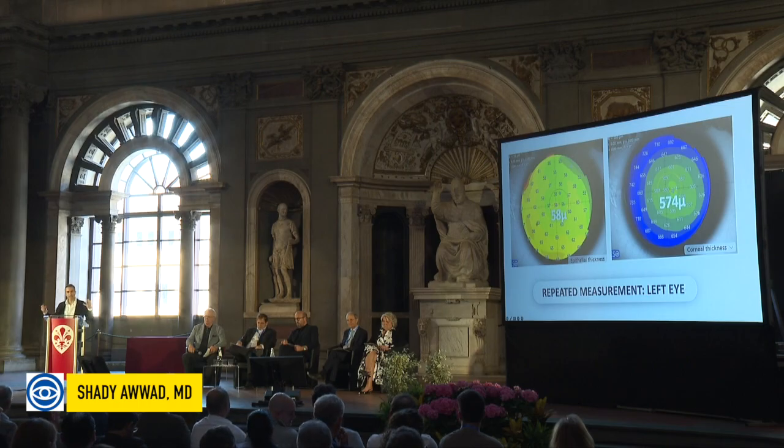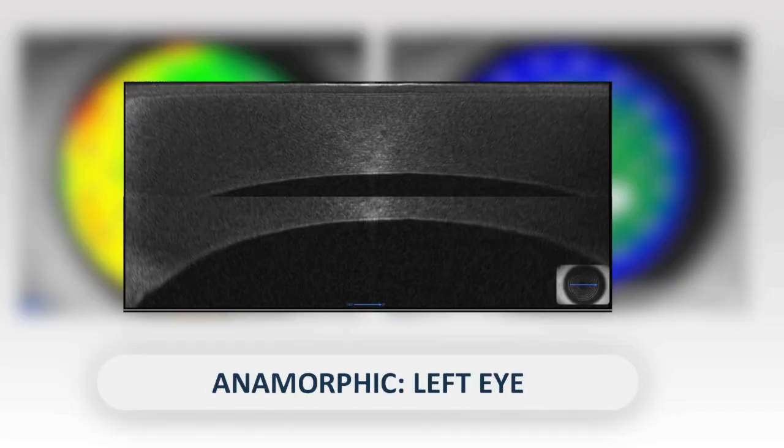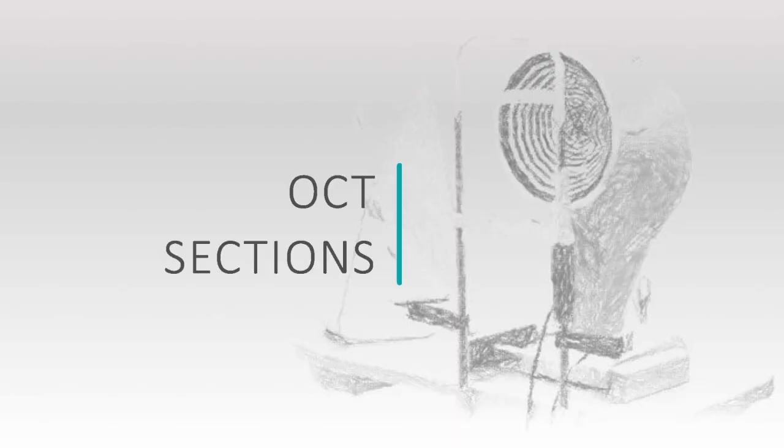So understanding your technology will help you understand these cases that will actually make or break the surgery. Otherwise, I would have programmed 78 microns and completely got something else. And again, I let the patient stay on lubrication for about a week or 2, because even though now I don't see this anymore, you can still see this hyperreflective tear film right on top of the epithelium.